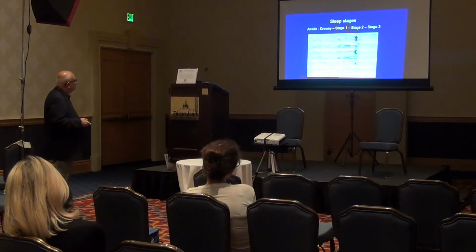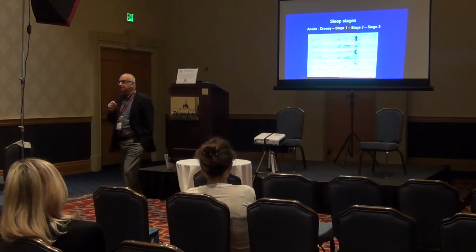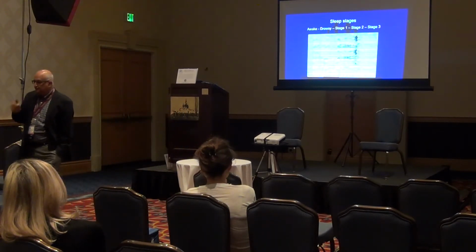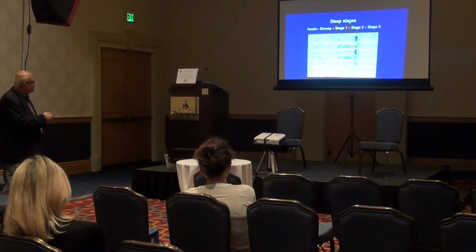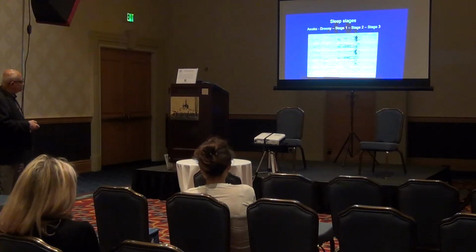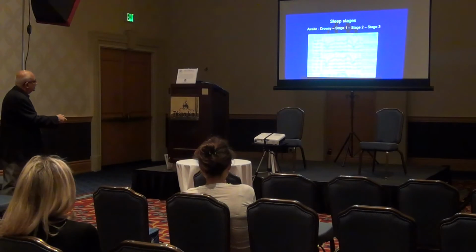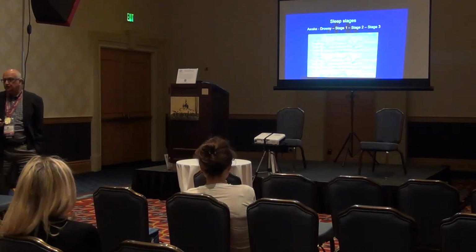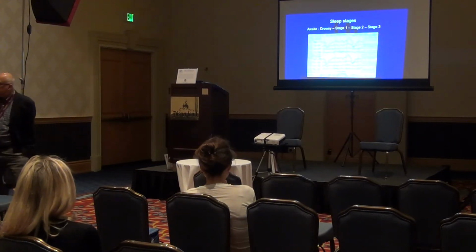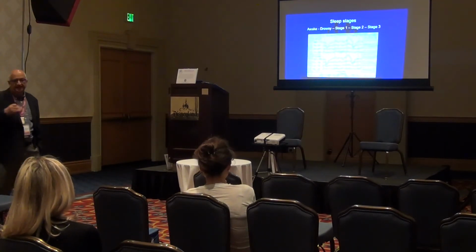But what they're trying to show you is that even in this, we can pick up that alpha rhythm, or the posterior dominant rhythm. So Dr. Hiroki put this box to show you that if you expand it, you can actually see that. See that? To count that in 1 second, that comes to about 11 or 12. So we have to pick up little moments.